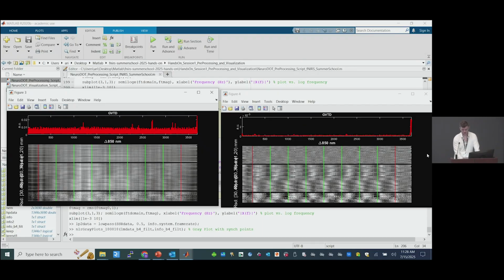This data is very clean and very devoid of motion, which is why we don't see too many peaks. We do see a peak at the very end, and what this is probably due to is the run finished, but before the recording was cut off, the participant probably started stretching and moving, and that's why we see a large spike at the end. That's just this big red line right here.